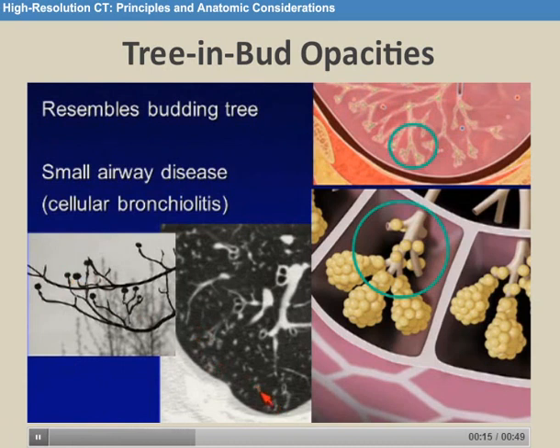And notice how it does resemble these centrilobular nodules that are both nodular and linear here in this patient with a small airway infection. Notice that these are fairly evenly spaced. They do not touch the pleural surface, and these are what we call tree-in-bud. Now, I shot this picture myself one spring morning, and of course these are a wonderful herald of good weather to come, so we'd like to see tree-in-bud in Boston on our trees, not necessarily in our patients. But in the diagram here, I've drawn a circle to show you what part of the airway structures are involved to form this so-called tree-in-bud appearance.